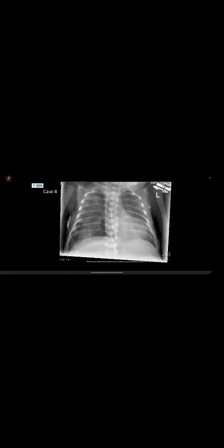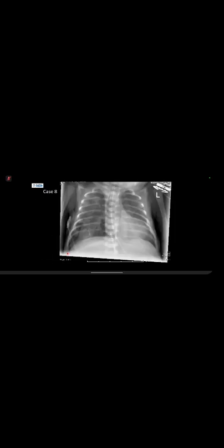So if we go to case 7, and if we just show the deep sulcus sign for the people in the audience, that'd be great. Okay, it's gone all the way to the top now. Hang on. You were just there. Case 7. Yeah, this was actually case 8. You wanted 7. Sorry, I got my cases wrong. Yeah, it's case 8, the one with the deep sulcus. Yeah, it's this one.